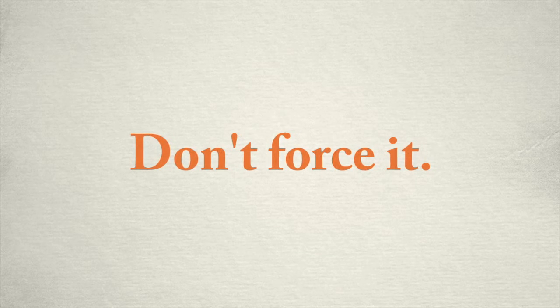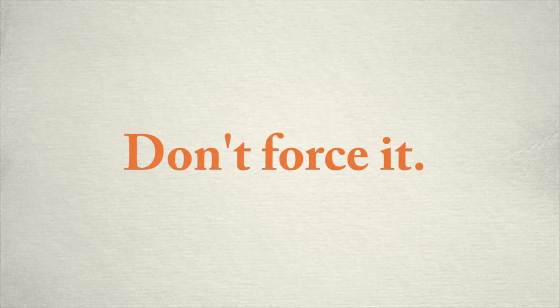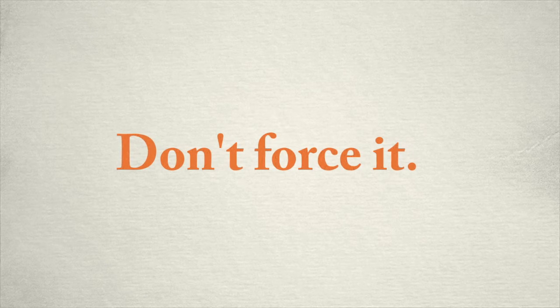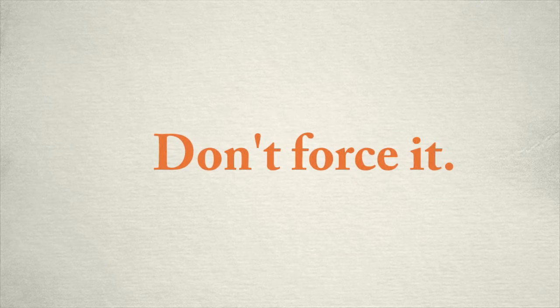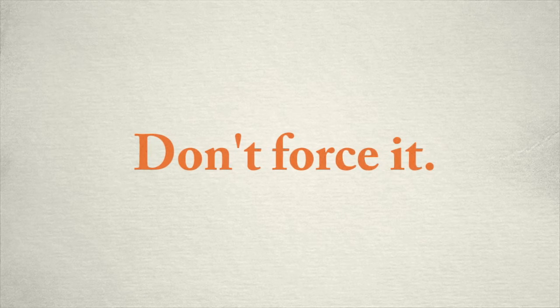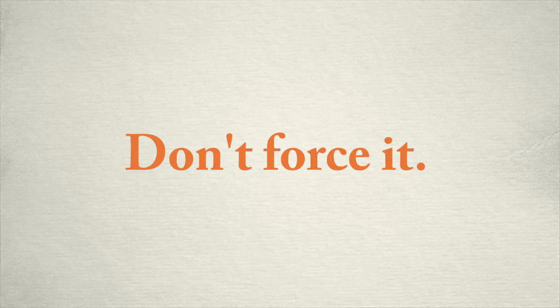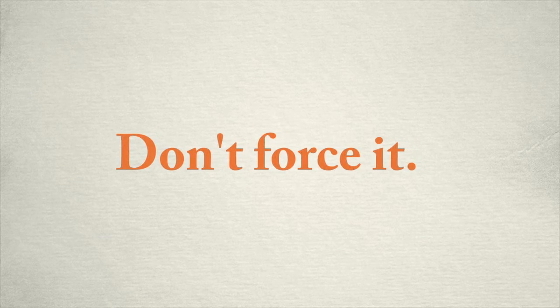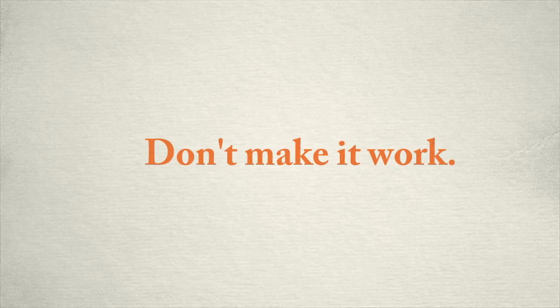Everyone learns language in their own time. You wouldn't learn a foreign language in a week, so we shouldn't expect someone to learn the PODD in a short amount of time either. For some individuals, it may take weeks, months, or even years to see significant results. I'm currently seeing an increase of about 5 interactions per month with the PODD, and most of those are of the student just touching all over the first page or using both hands, so there's no distinct icon selections the majority of the time. Just be patient. It'll come eventually.